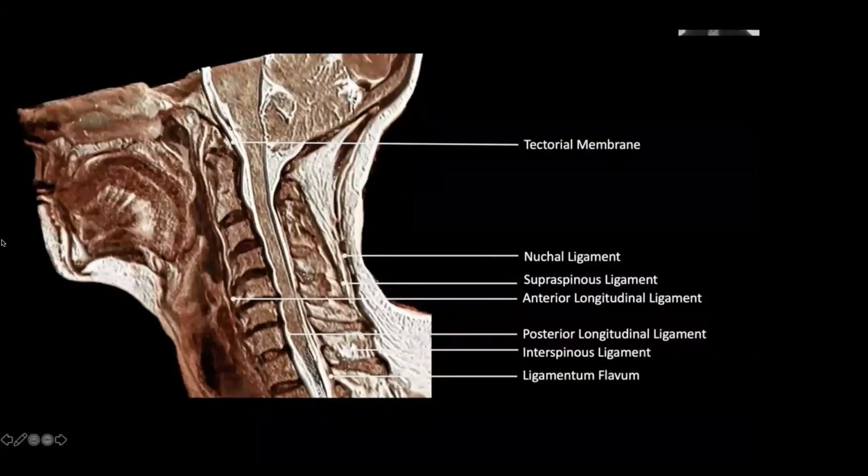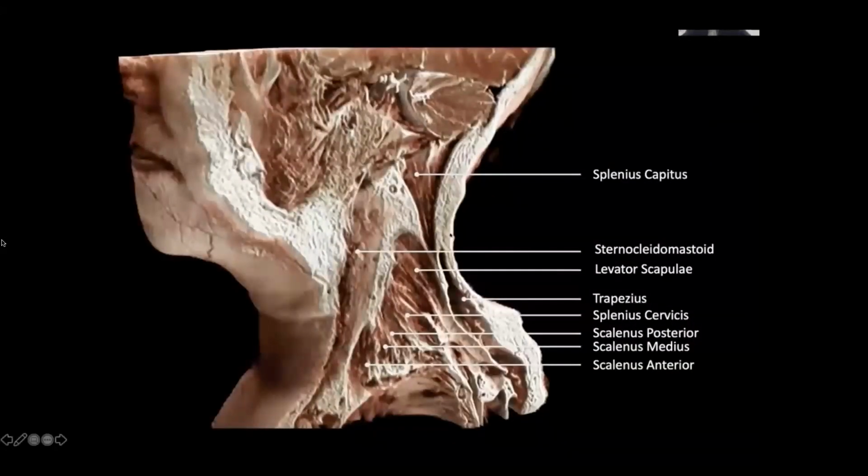The dorsal soft tissues, the interspinous and supraspinous ligaments are important to be aware of. Individual muscle groups, we can depict those very nicely, again in 3D. I feel like if there's an area of anatomy you've never learned, it's always good to start with a 3D and kind of get a broad sense of what you're dealing with, and then working backwards.